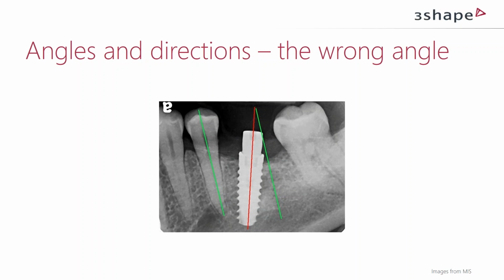And I think it's interesting because I've had that experience when talking to dental labs. Not to point fingers at any surgeons out there, but they all say, we have tried to restore implants like this. And if the angulation is just too much off, then we can try our best in the lab to restore it, but at the end of the day, we know that the restoration we will be delivering is not going to last as long, or it's going to be hard to maintain. So I think this is a really important point, and seeing this picture makes it quite clear, at least to me, who's not trained in implant planning or surgery as a living.